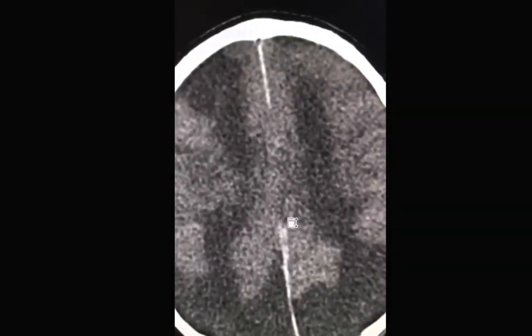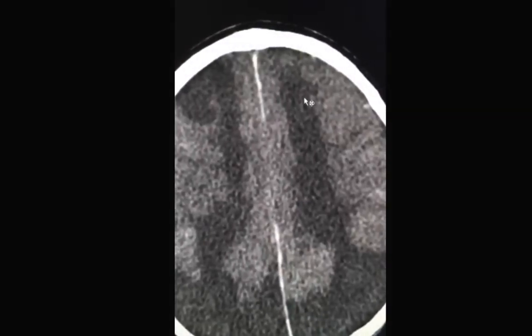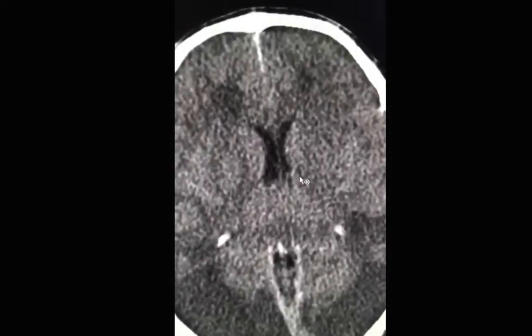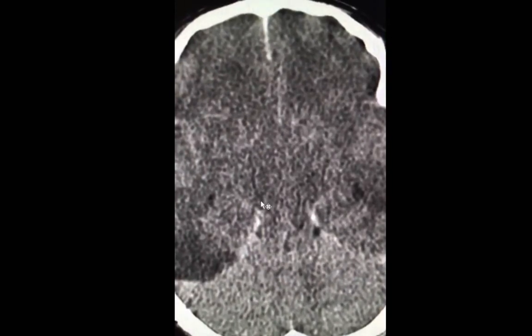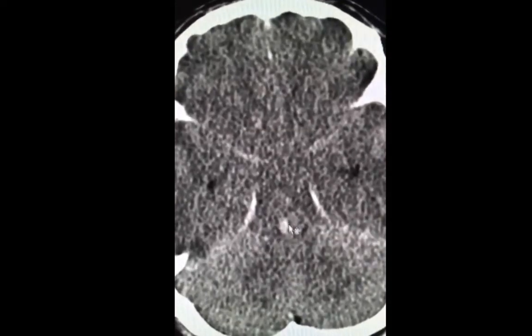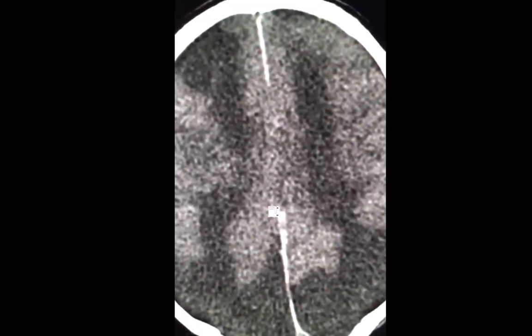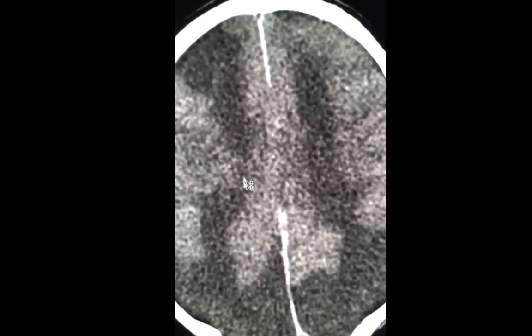So this is a nice case showing features of severe hypoxic ischemic events in the form of superficial and deep watershed infarcts, transtentorial herniation, and most importantly, the reason I'm showing the case is secondary Duret hemorrhage. There are many neat and practical points that we could talk about when assessing patients with increased intracranial pressure, and we'll leave that for other sessions.